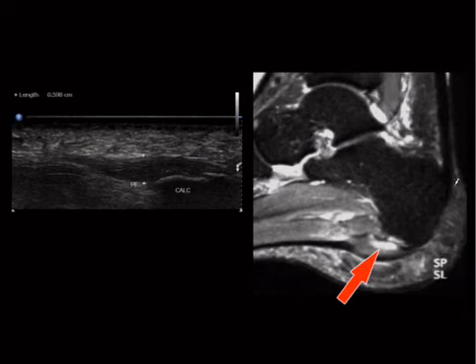So I've got an arrow here pointing to the fluid right at the bottom of the heel, where one of the bands of the plantar fascia runs, shown with ultrasound with calipers on it. How do you know it's too thick? Because there are calipers on it. So for the purpose of multiple choice, when people put calipers on stuff, it's probably either too big or too small. This looks too thick, so I'm saying it's too thick. If you really want to know, people will say greater than 4 millimeters. I just remember there are calipers on it.